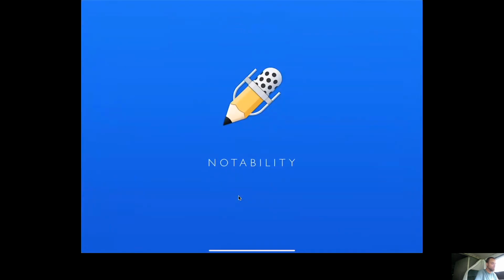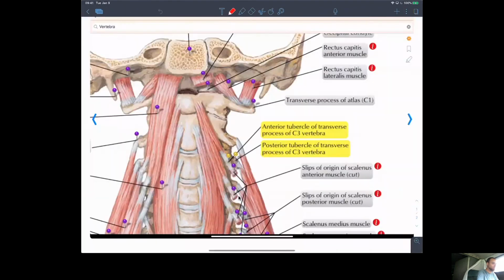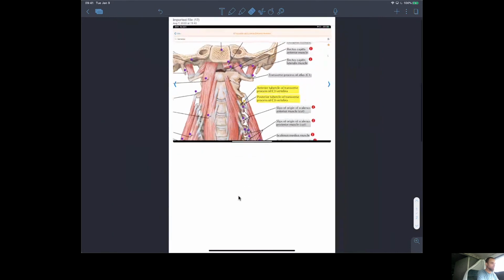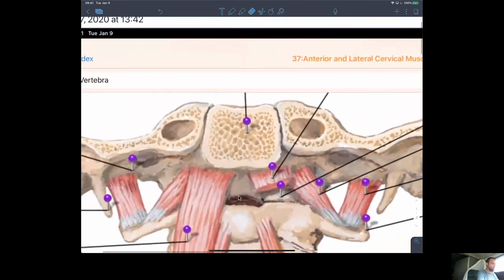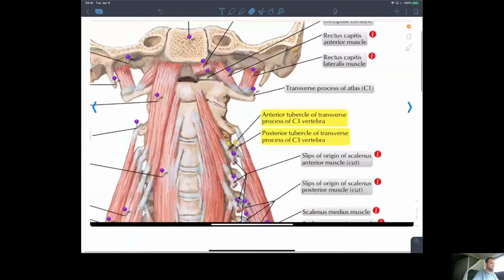And you could switch into Notability. Notability actually works a little bit better, I think, for markups. So a little bit easier to work with, but I know I appreciate that you draw and everything. And so being able to draw and quickly take that stuff away, I think is really huge. And being able to say, oh, I want to focus in on this cortical bone right here. Great, simple stuff.